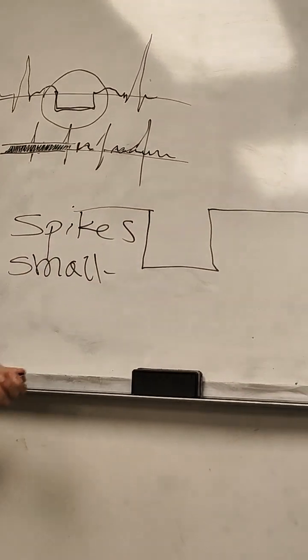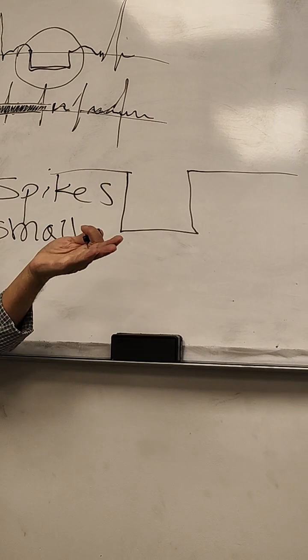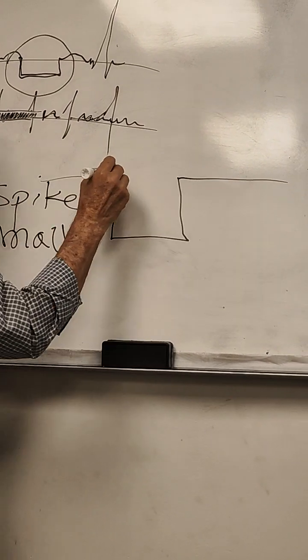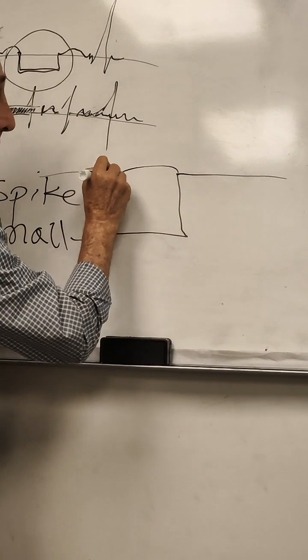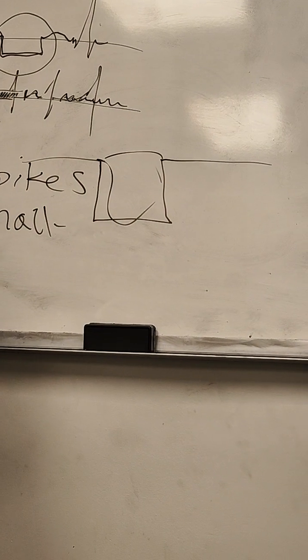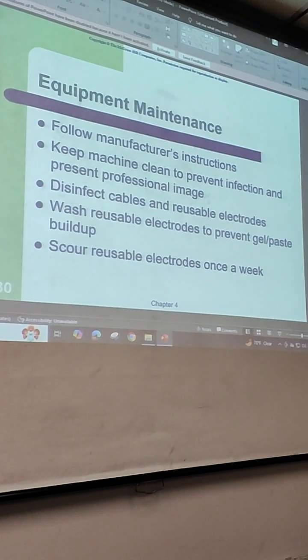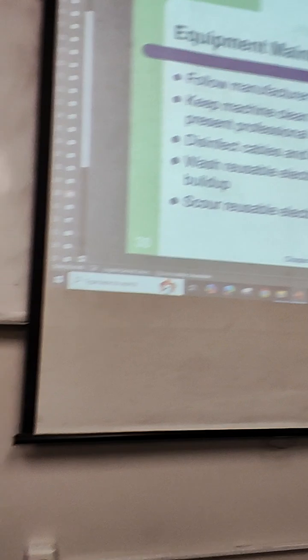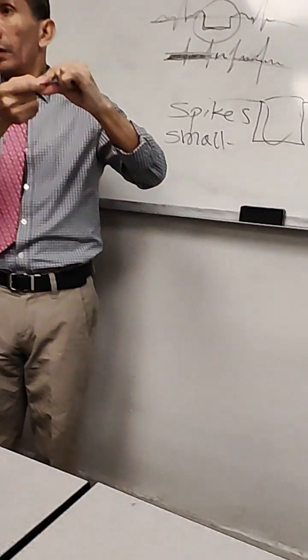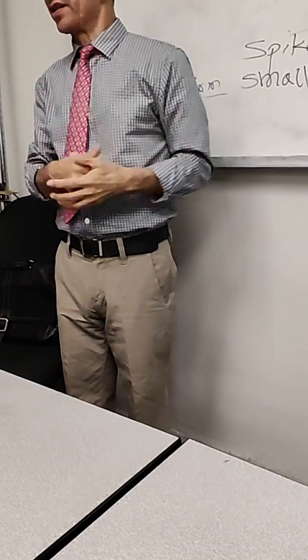And that is known as artifact, not the waves. That's nothing. It's just that there is an interruption. There used to be a bridge right here. Now it's not, so you have to go down. So that is that something is not plugged in. The electrodes are not connected to the wires at all. So if you're not connected, how are you gonna get this electricity going from one place to the other? It's not.